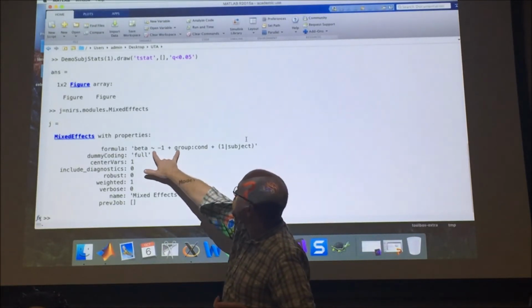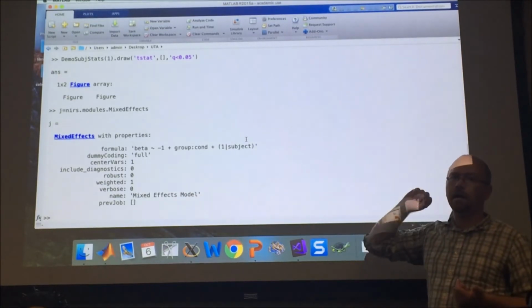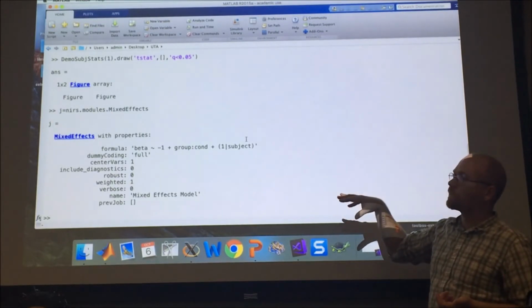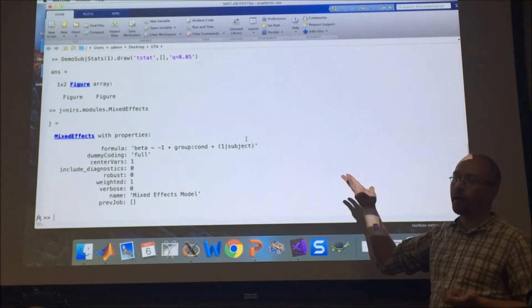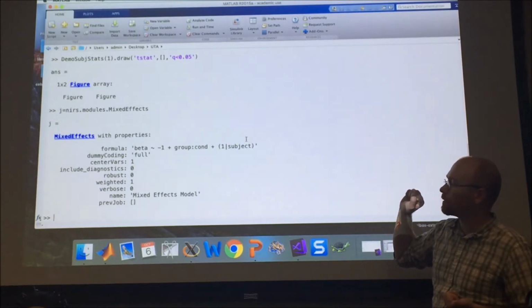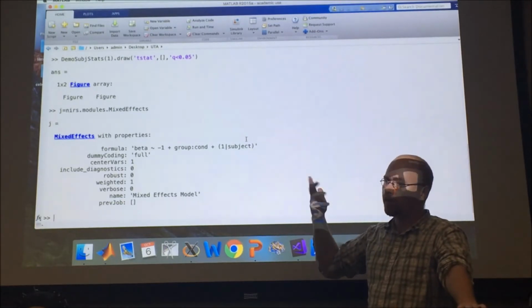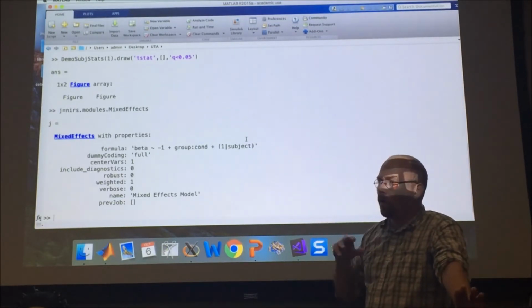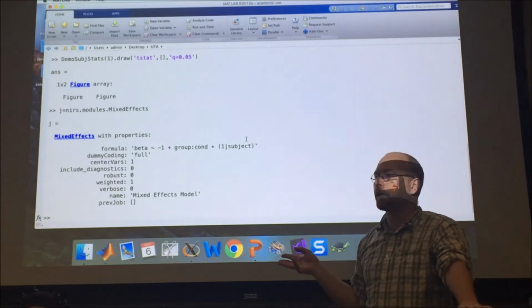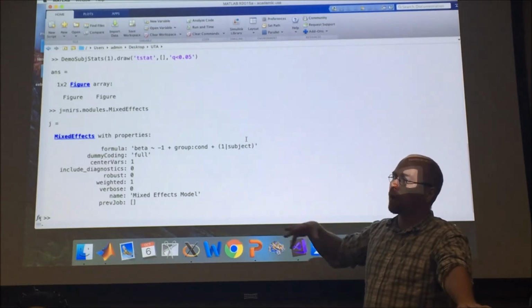And one of the features in this job is what's called the formula. The formula is how I'm going to specify my ANOVA test, okay? Same as you would in SPSS or so. Any features, that subject, that visit, that group, and the condition, are available to me to use in the formula. It's running a function in MATLAB called LME fit, for linear mixed effects model fit, I guess. There's a whole slew of ways to specify the formula, including both linear and nonlinear interactions and so on. So anything that's in that demographics can be called within that formula.